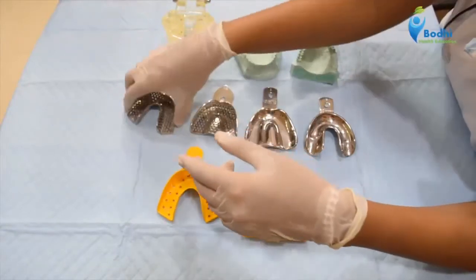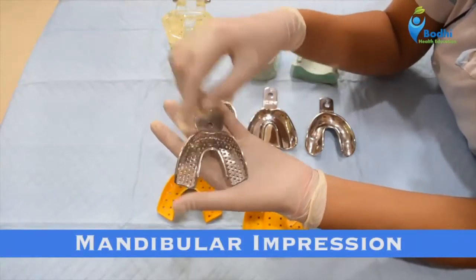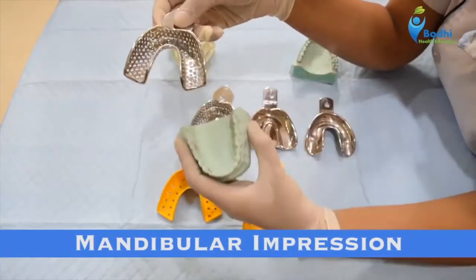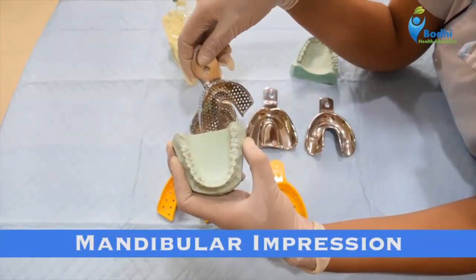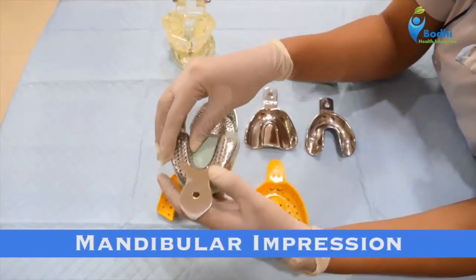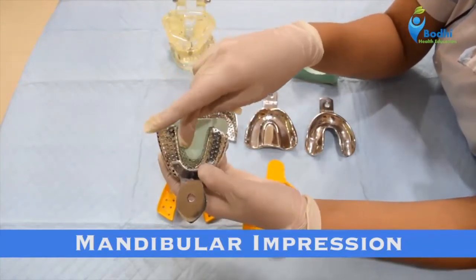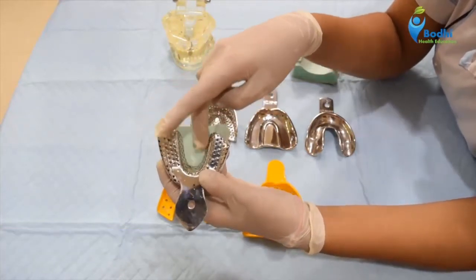On the contrary, the mandibular impression tray has got the lingual flange area. So while recording the mandibular impression, as you can see, this is a mandibular teeth model. This mandibular impression tray fits like this and it records the lingual area through this lingual flange.